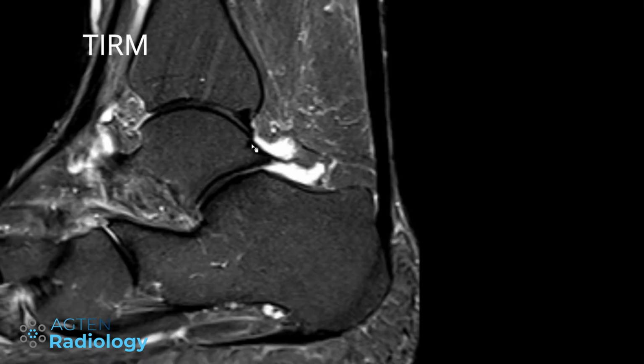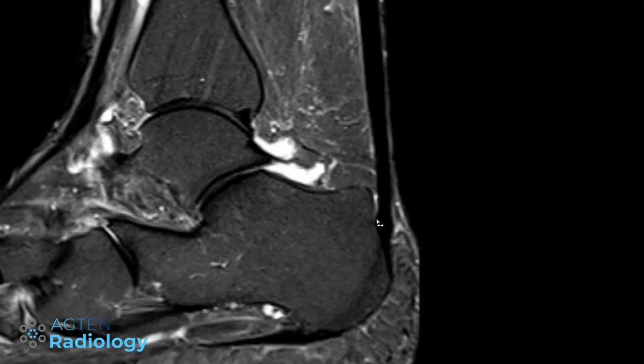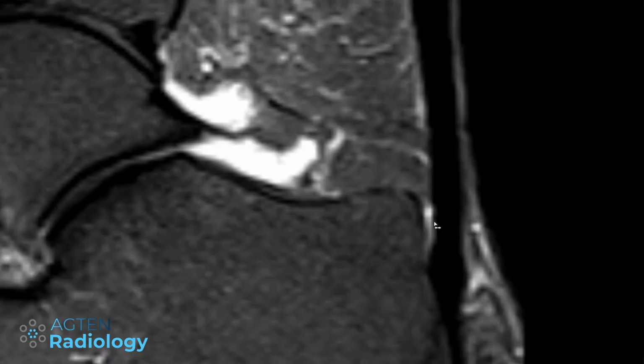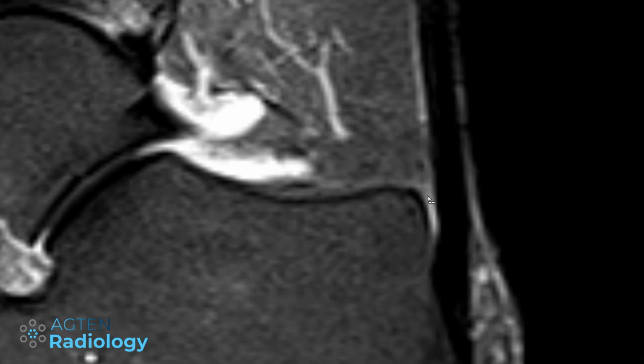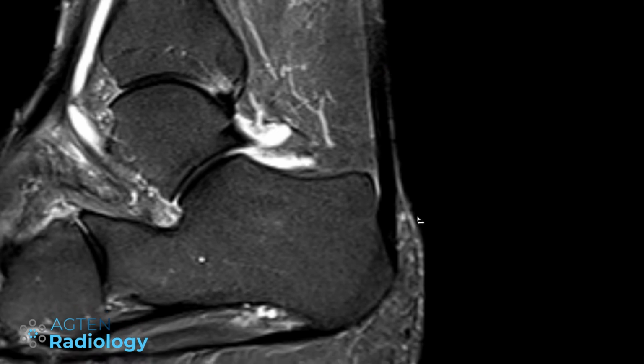So this is now another patient that had no pain in this region, and you can see we don't have a really relevant fluid collection here, but we can still see the bursa. We have a tiny amount of fluid here with this tiny dot here. So this is clearly still in the range of normal. And if you compare this with the previous cases, you get the impression when it's abnormal and when it's normal. Sometimes you don't see anything at all, but just keep in mind that a tiny amount of fluid can still be normal, especially if there's no pain or other associated findings.